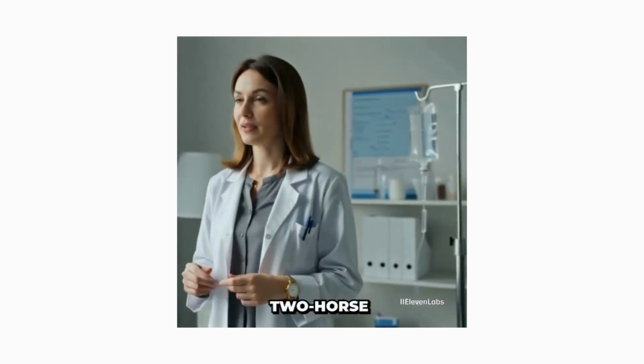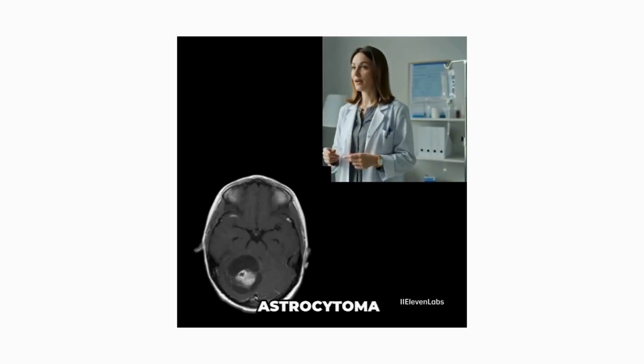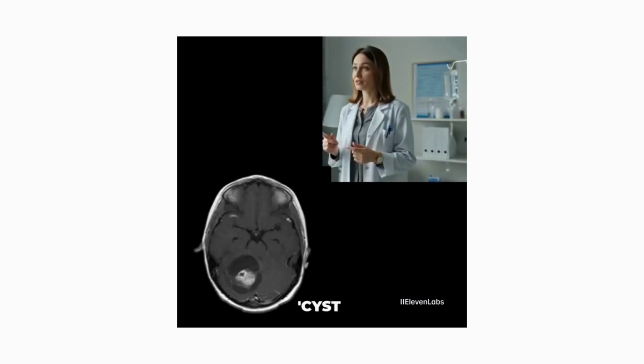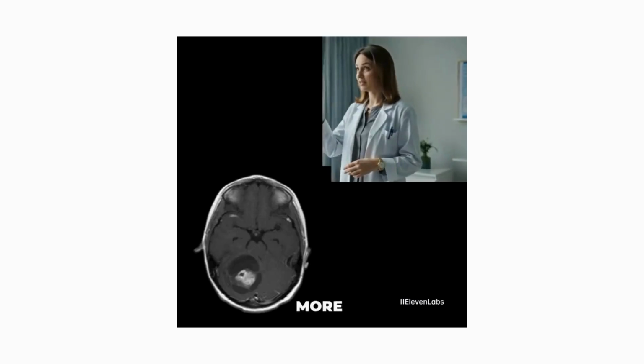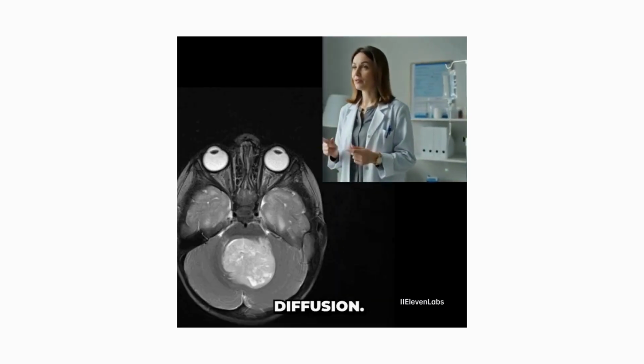It's not always a 2-horse race. We must consider the mimics. Juvenile pilocytic astrocytoma, JPA. Look for the classic cyst with an enhancing mural nodule. Unlike our mystery case, JPA is usually more lateral in the cerebellar hemisphere and lacks restricted diffusion.